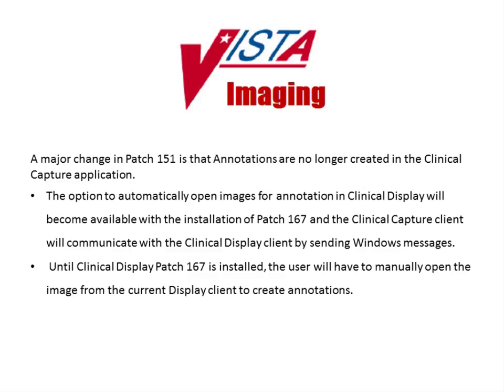The other items addressed in patch 151 can be found in the patch description document and in the current Clinical Capture user manual, which is on the Vista Imaging SharePoint, or can be accessed by clicking the Help menu option. This is the end of this module.